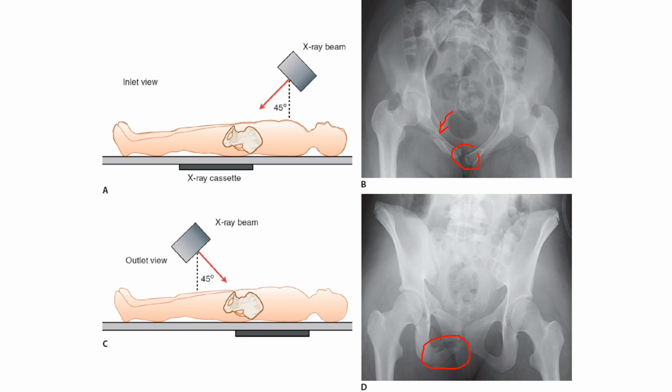Other useful studies of the pelvis are the inlet and the outlet views. This will help you see the integrity of the pelvis. Look for widening of the sacroiliac joint or widening of the symphysis pubis or fractures of the pubic rami. So in the upper X-ray picture, you will see a fracture of the pubic rami in the right.